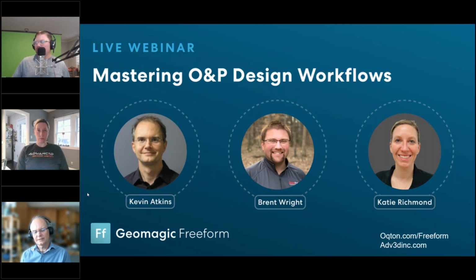So STL, OBJ, PLY, IGES, Parasolid, binary and text, STEP, we export and import all those. So we're happy to work with other CAD systems as well in the entire workflow.